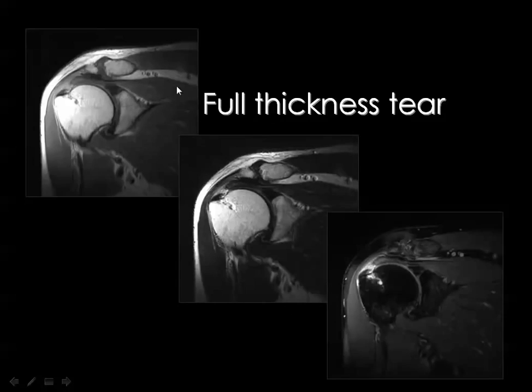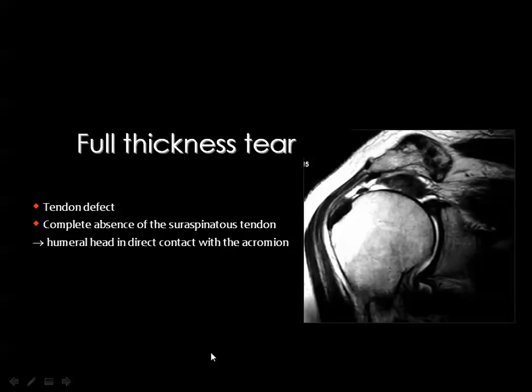These linear high signals are considered within normal, but whenever the muscle is atrophic, I will show you an example. And here is extensive osteoarthritic changes of the acromioclavicular joint with rupture of the supraspinatus tendon, and you see the cut edge is from here to there. This gap is about 2 centimeters, for example, and you look to the muscle and the muscle is intact.